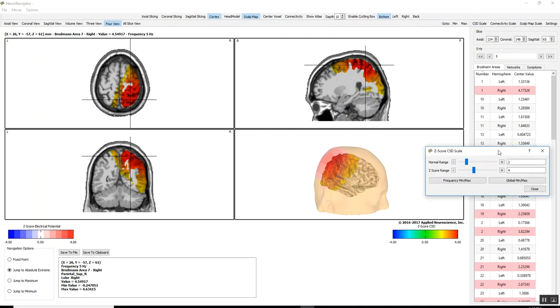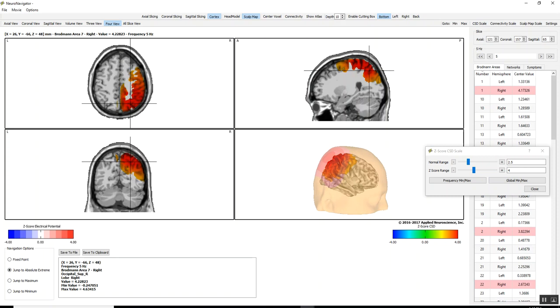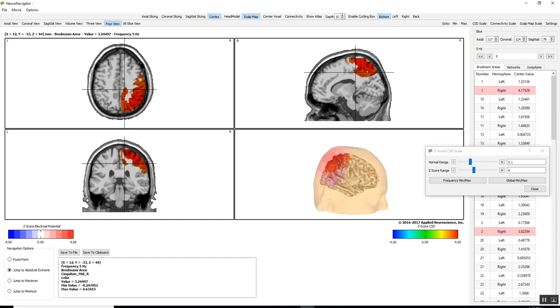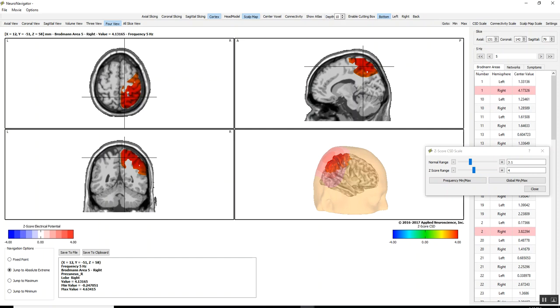And this control box comes open, and here's the z-scores. We're going to look at the z-scores from, let's say, 2.5 to 4 standard deviations. And those are z-scores that are inside, actually, these voxels, which is what we're going to look at. We could change that to look at more or less, but we'll just do this so we know we're getting the most important parts. And we can see here, if we click here, you can see that is 3.24 standard deviations outside of normal, so it's reasonable to keep this set that we're looking at here.